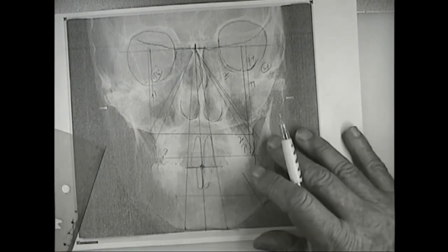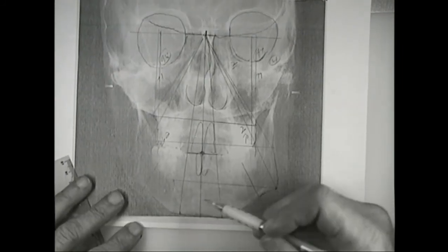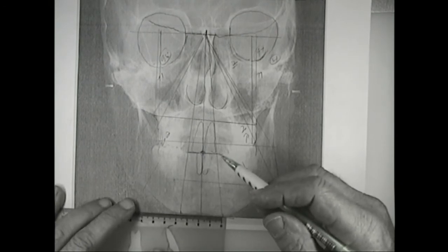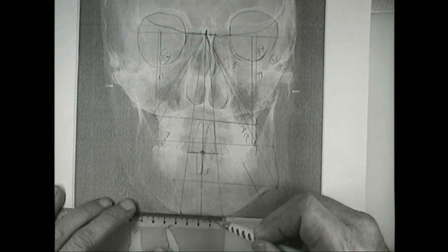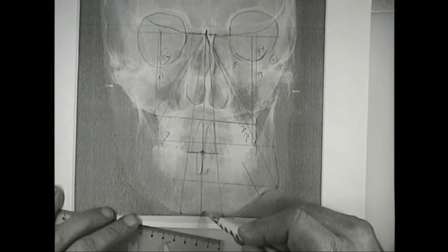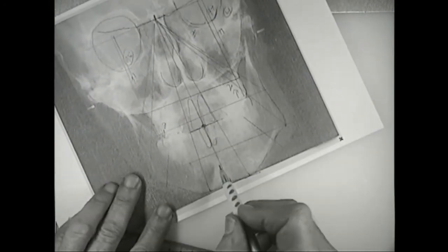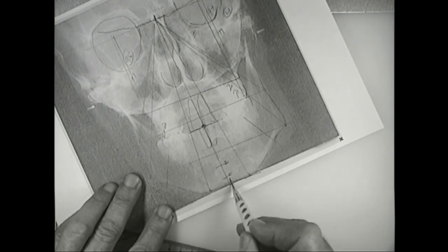An important thing for me here, you'll see here at the bottom, I can measure the difference, this is 36, it's 15, it's 16, there, that's the middle. So I'm very pedantic here that the midline's a little off, but keep in mind that if I'm going to correct the cant of the occlusal plane, the mandible is going to move that way, and the chin will also move that way.